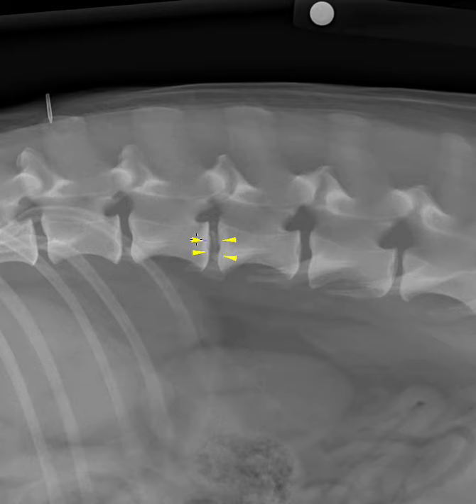The next thing that I see at this site would be when I move along my routine to look at the synovial articulations. That crescent-shaped radiolucent joint space here at L12 is larger than what I see here at L23. It's also at L23 slightly smaller than what I see here at L34. This is another sign that these two vertebrae are closer together than their neighbors. The disc is narrow and the joints are more narrow. Another thing that I notice is that Snoopy or horse head. When I compare the intervertebral foramen here to here, this one here at L23 looks more narrow to me, especially when we compare to L34.